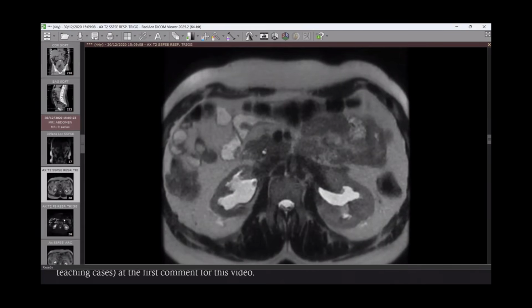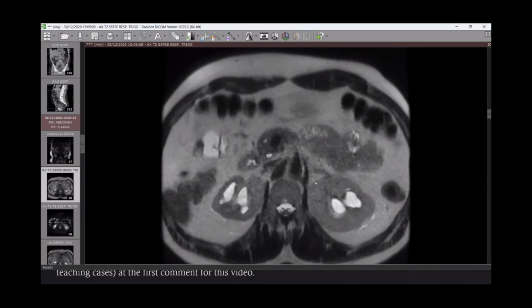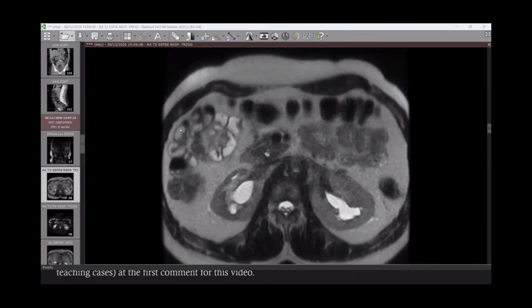All right, and this is causing the bilateral hydronephrosis. These are retroperitoneal soft tissue sheets, entangling the ureters and displaying dark signal on T2. Is it acute or chronic? Dark signal in T2 represents chronic fibrosis. Yes, it's mature fibrous tissue. Okay, so it's chronic retroperitoneal fibrosis. Okay, very nice. Let's go to the next case.